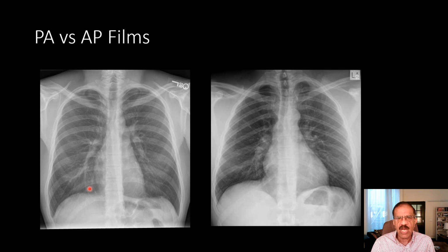Now in X-rays, I always recommend that first you describe what you see. First you describe the opacity. X-ray usually shows opacities, and you first describe it, and then you draw a radiological conclusion, and then you draw a clinical conclusion. For example, if there is a rounded opacity of whatever size on the right side, left side, apex, you describe that, and then you say it is like a tumor, and then you make further judgment.